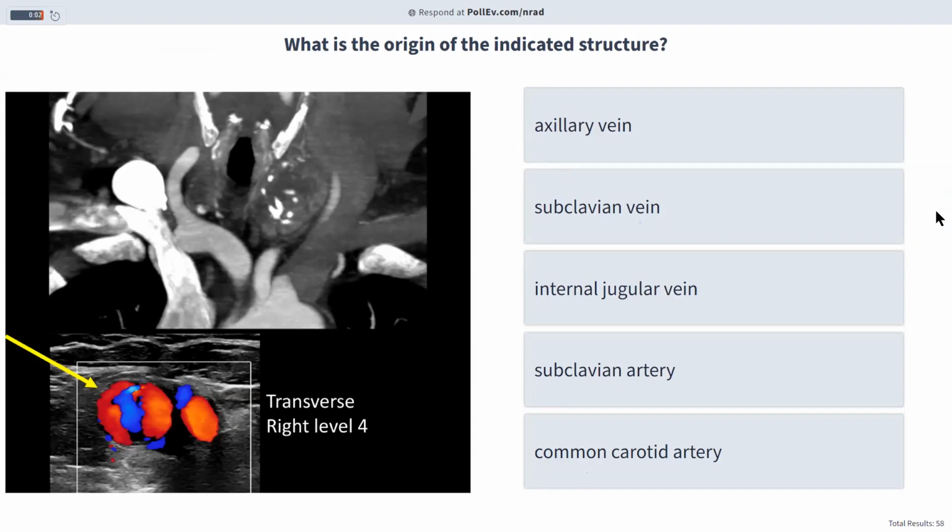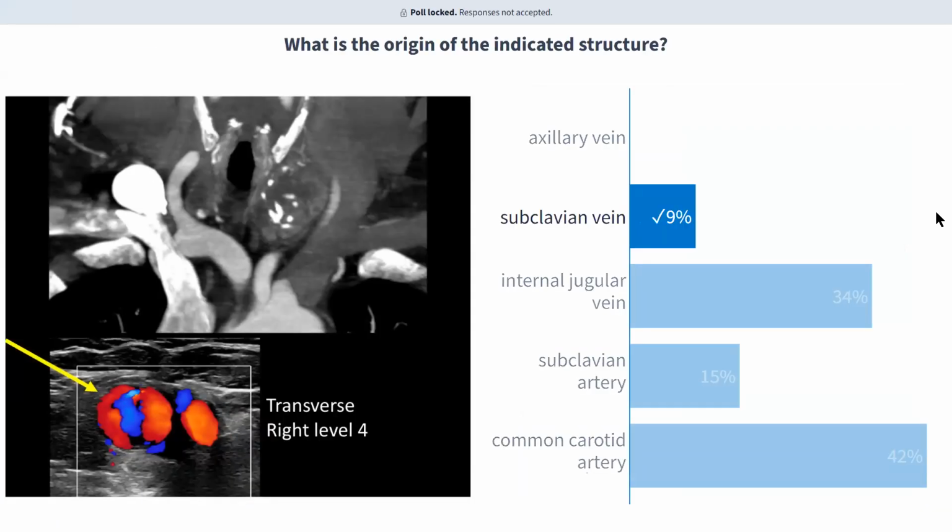Occasionally on the core, you'll see questions. There's like random things that require some kind of problem solving thinking. And their intention is to test things of practical importance, they might not always be some catchy disease entity. But in this case, it was a real world diagnostic dilemma when the radiologist saw this on a thyroid ultrasound, this kind of Pepsi appearance on color Doppler, suggestive of a pseudoaneurysm. But then the question was, where did it arise from?